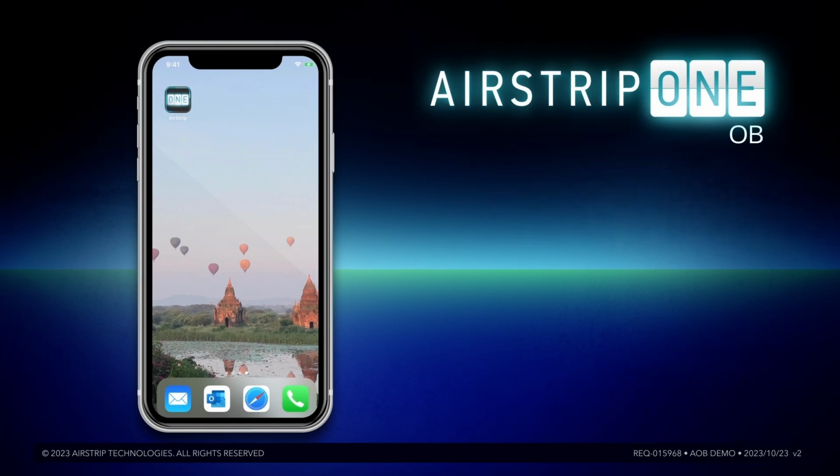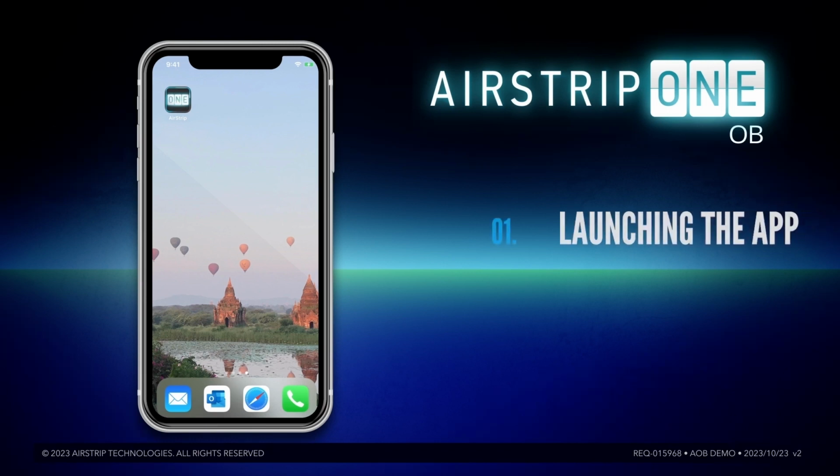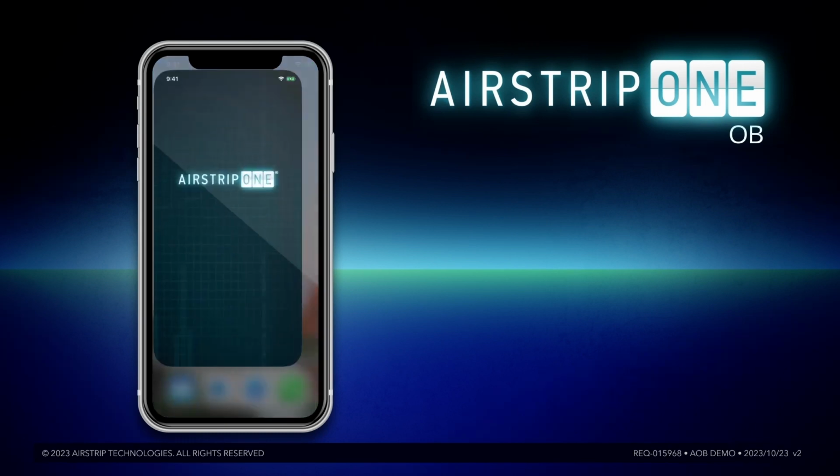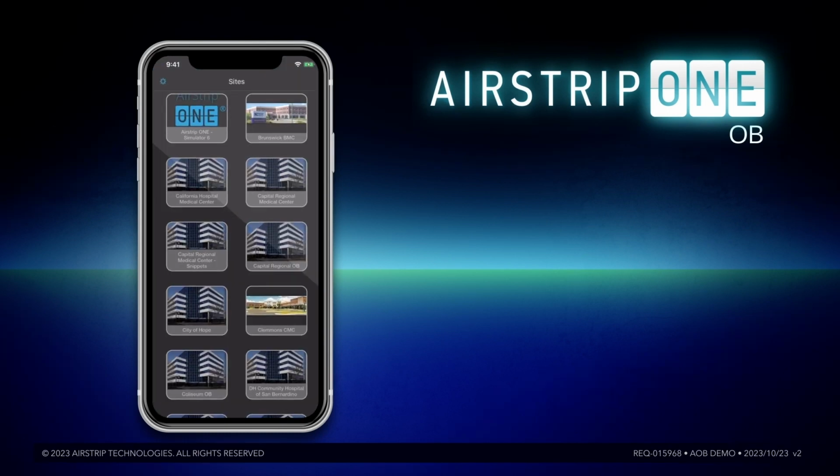From your phone, you will see the AirStrip ONE application icon. You can see it here, in the upper left-hand corner of the phone's home screen. After the application is downloaded and set up on the user's phone, the user will tap the application icon to launch AirStrip ONE. After clicking the AirStrip ONE application icon, you will be taken to the site screen.